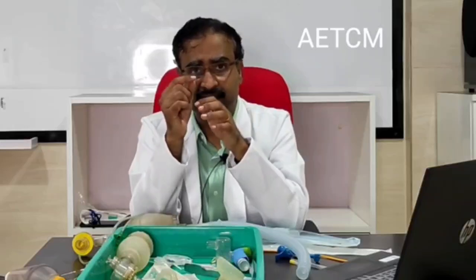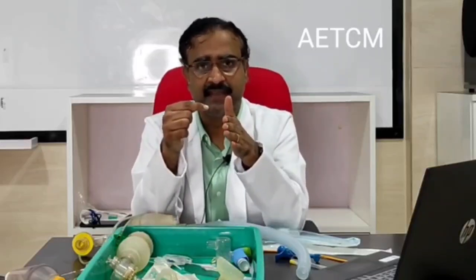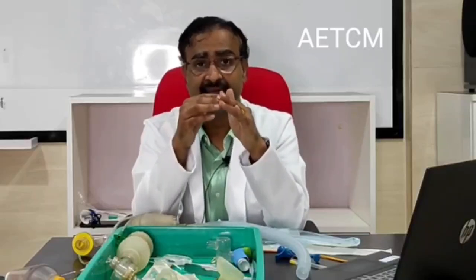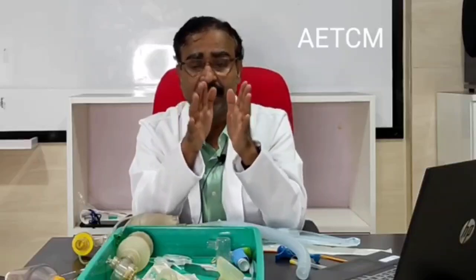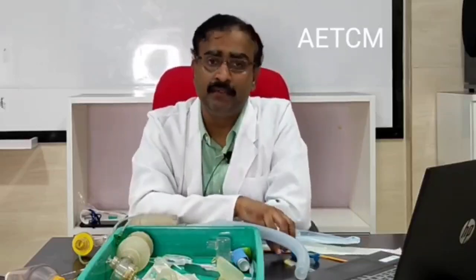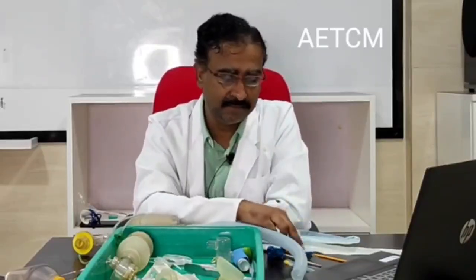You look for the tibial tuberosity, keep a finger space below, and on the medial side, you find a very big flat surface. It is there that you can actually drill. Fortunately, that space remains very prominent even in neonates, and that is exactly the place where you will be using this particular needle, even in a neonate. Okay, right.